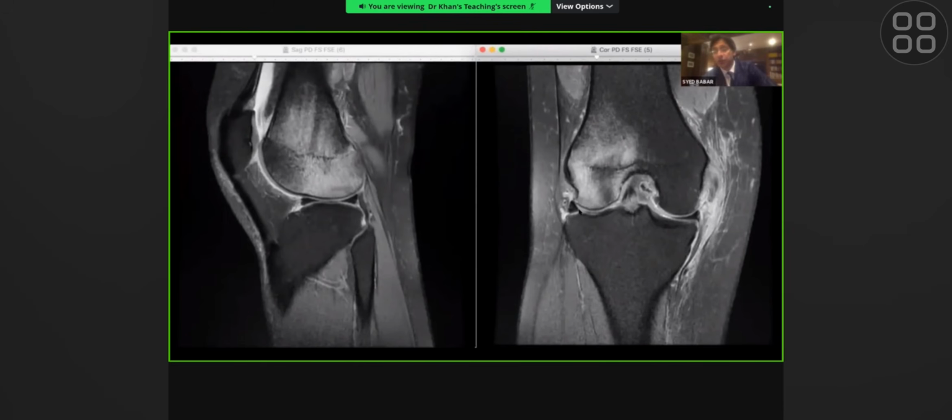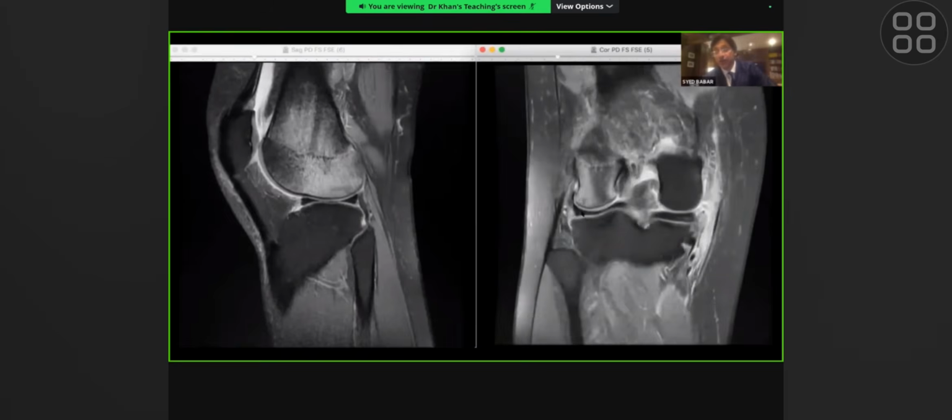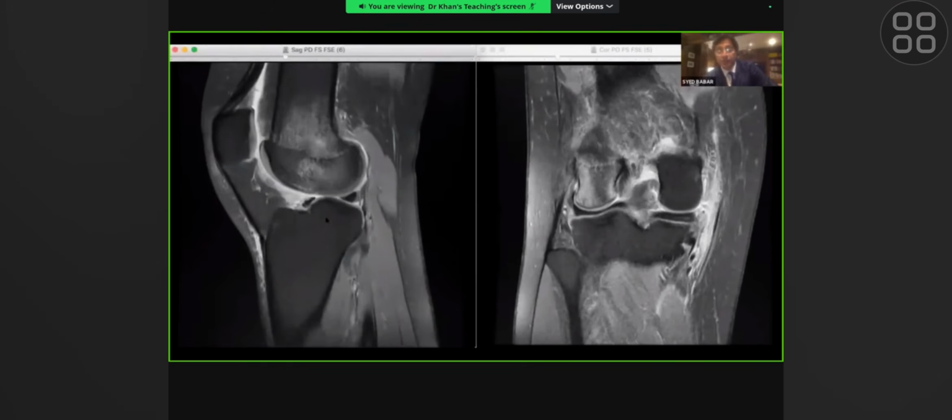If you're not absolutely committed, you just say there's blunting of the inner third margin of the body of the lateral meniscus, which may suggest that there is a small radial tear of the inner third margin. I would definitely make a comment, even if it's negative or positive, and tell the examiner that you've seen this. You keep going back and the posterior horn looks beautiful, so there's nothing there. So we picked up two things. Let's keep going towards the center.